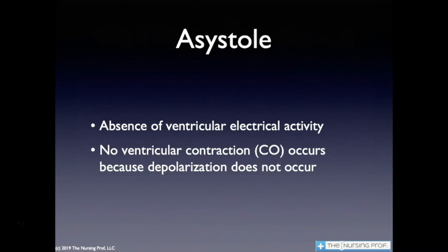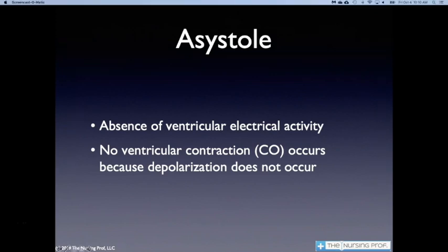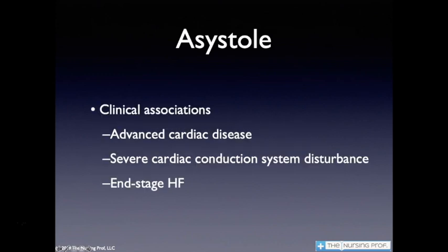If there is no electrical activity of the heart, we call that asystole. Previously, we talked about that baseline that our EKG goes back to. So our EKG goes back to this baseline, and we have our impulses going up and down from that baseline. Asystole will just be a baseline. There is no electrical activity going on here. Since there's no electrical activity, then there is no ventricular contraction. There's no cardiac output. So in asystole, we want to try to get that heart restarted.